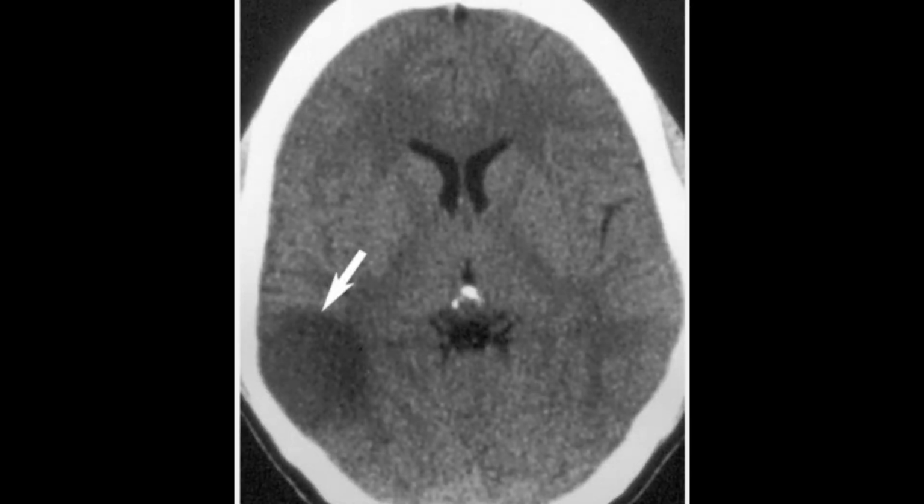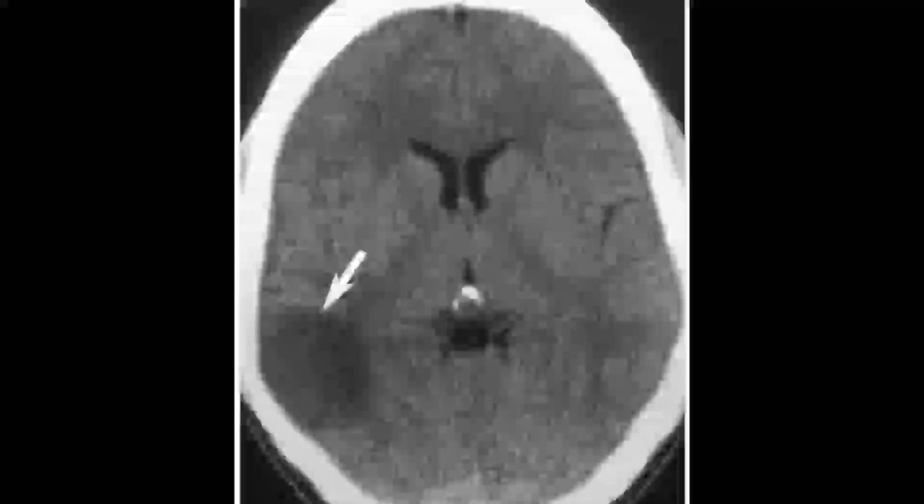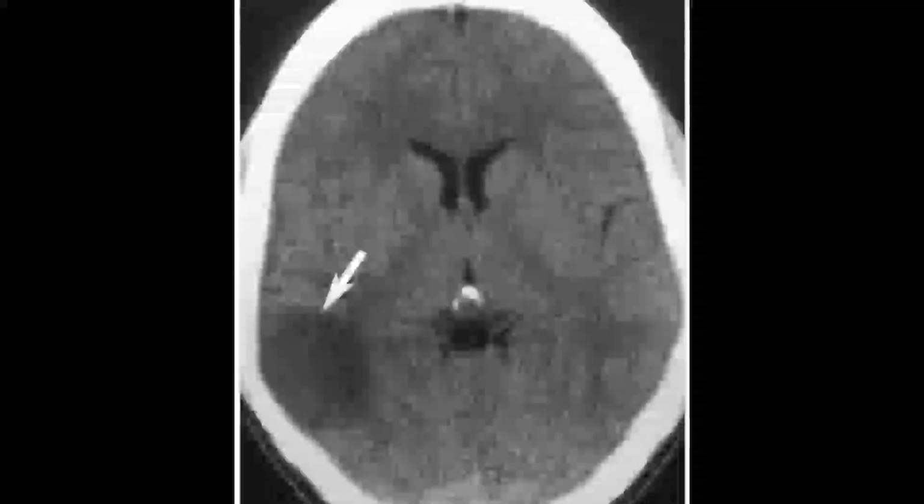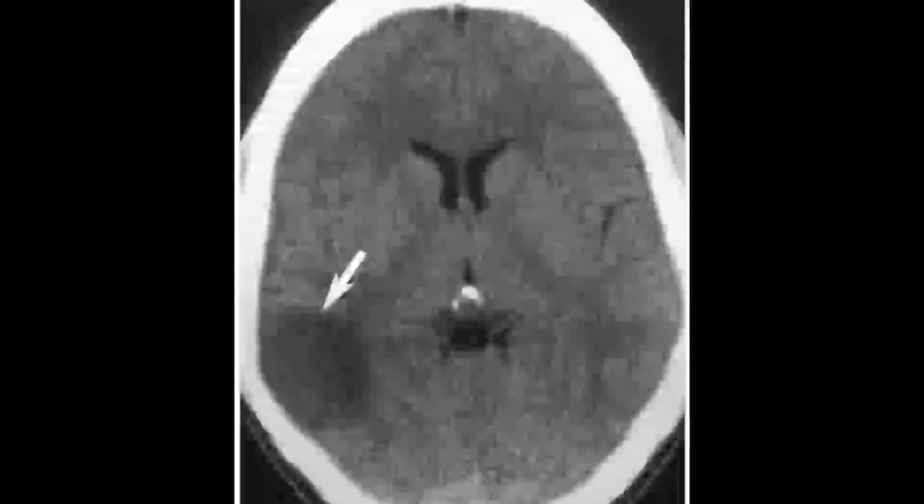This is a well circumscribed, unencapsulated region. It is not that infiltrative and diffuse, as it happens to be in diffuse astrocytoma, but it usually appears hypodense and involves the cortex, and it also causes cortical thickening. In that case, you cannot particularly see hemorrhage. However, normally in oligodendroglioma there will be calcifications.